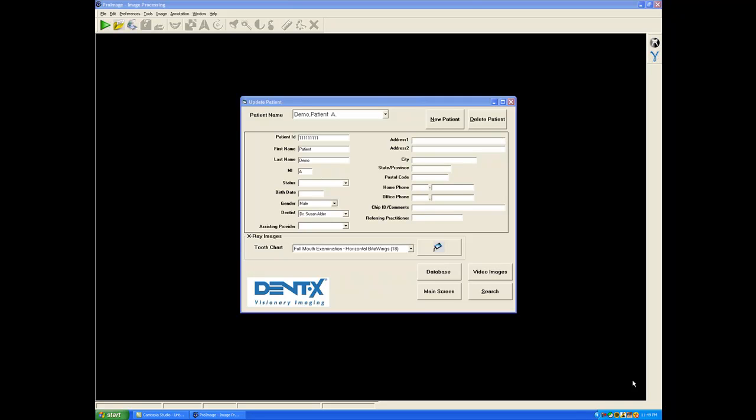And other times the idea of exporting an image would be to archive it for burning onto a CD to transfer images over and hand them off to a client so that he could take them off. Could be relocating perhaps to another place in the country. He's going to have another dentist and want to give them electronic records. So that would normally be the preferred format, would normally be TIFF file. So I'm going to show you how to do these two different ways of exporting images.